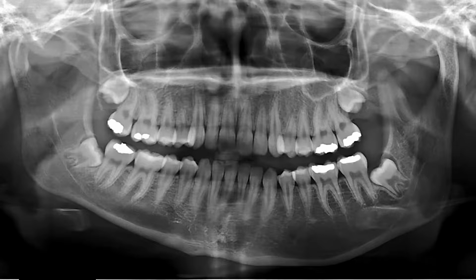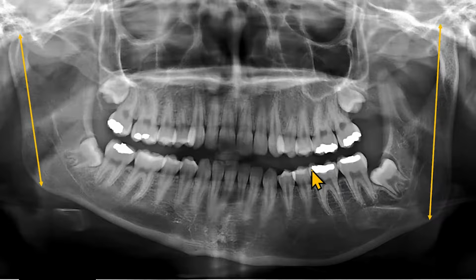It may also happen that the patient's jaw is actually large on one side. In such a condition, the image will be wide on one side. In this example, we see that the left ramus is very tall, taller than the right side. Also, the left body of the patient is taller. So in such cases, there may be lateral errors which, even if you try your best, you may not be able to eliminate.